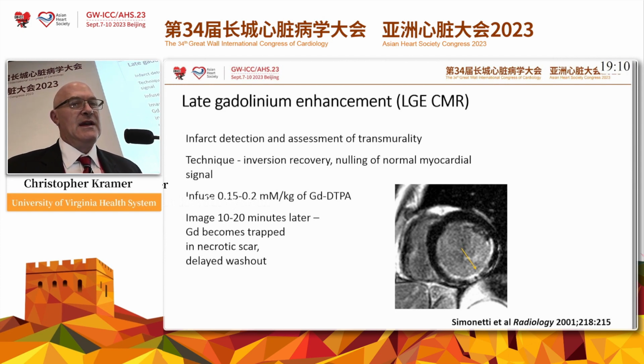But most importantly, late gadolinium enhancement, or LGE, the technique that was developed in the late 1990s for detection of infarction and assessment of transmurality, such as this patient with an inferolateral subendocardial infarction.